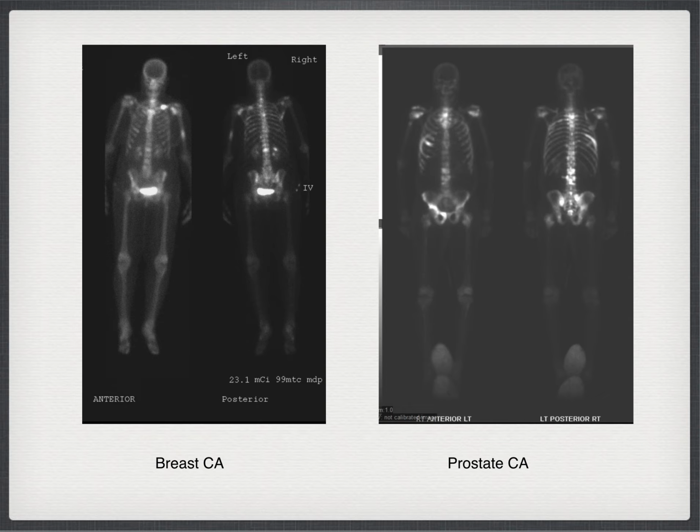So these two images basically sum up what we use the bone scans for. The image on the left is a woman with breast cancer, and we see multiple foci of uptake in the ribs, spine, as well as left humerus. So we know that this is extensive bone metastasis. The image on the right is a typical patient with prostate cancer. You can actually also see a Foley catheter bag on the floor, and we see lots of uptake in the spine, ribs, and bony pelvis consistent with metastatic disease. And these two images essentially illustrate the most common abnormal appearance of the bone scan.